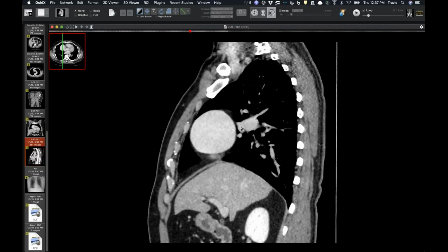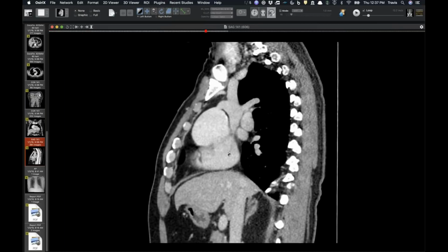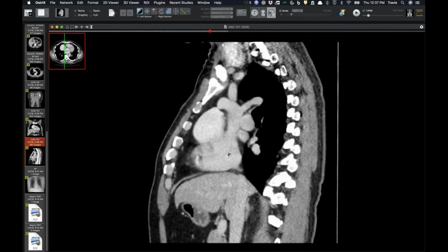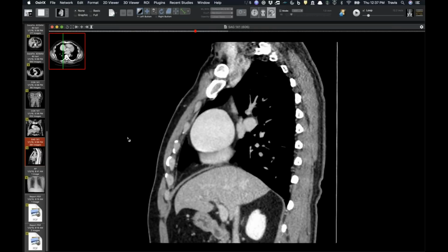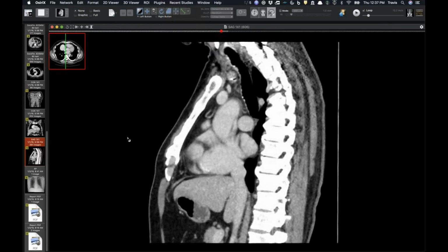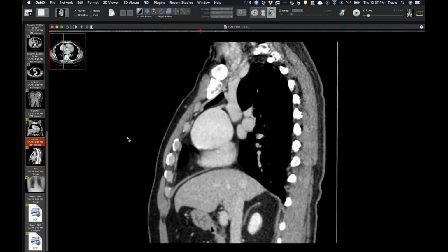Oh my word. It fills so completely with contrast. I keep thinking there's got to be an outflow to enable it to fill this well, because it is sort of delayed enhancement here. It's not emptying very well. The other veins have emptied. That's a good point.